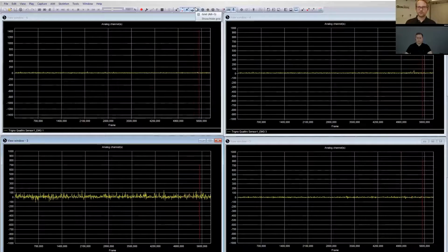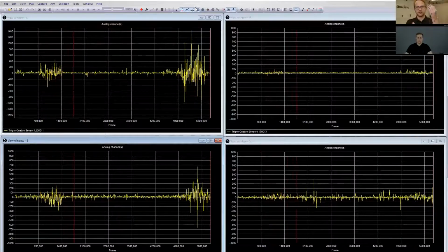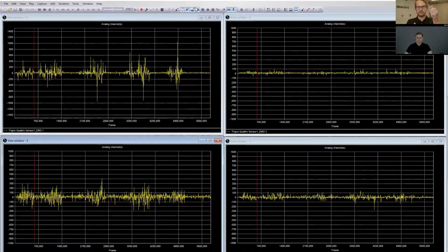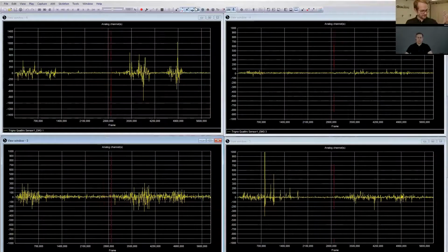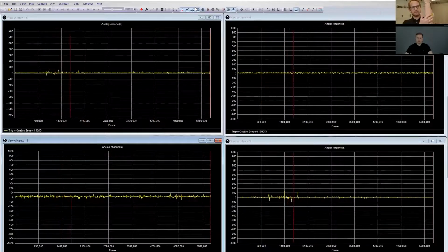And what we always recommend to do first, no matter how you want to use the system, is to do a quick check of the signals. So in this case, I've got the first sensor, which is right here on my hand. And I can see if I'm contracting the fingers, then that one is activated. The second sensor is the yellow one on my arm, which is one of the extensor muscles.